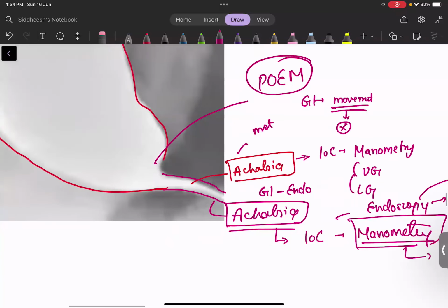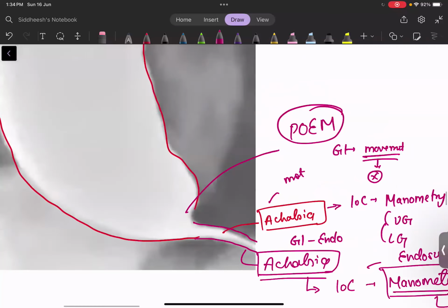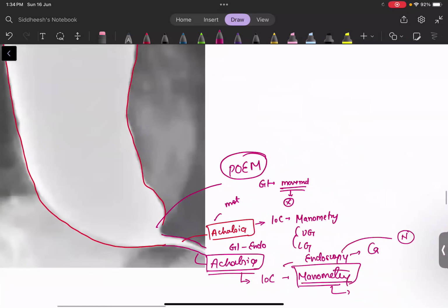What is the reason for such dilatation of the esophagus? Remember, our esophagus and intestine are not open organs. These are collapsed organs. If you are eating food, then only it will open. Afterwards, it will be a completely collapsed organ.